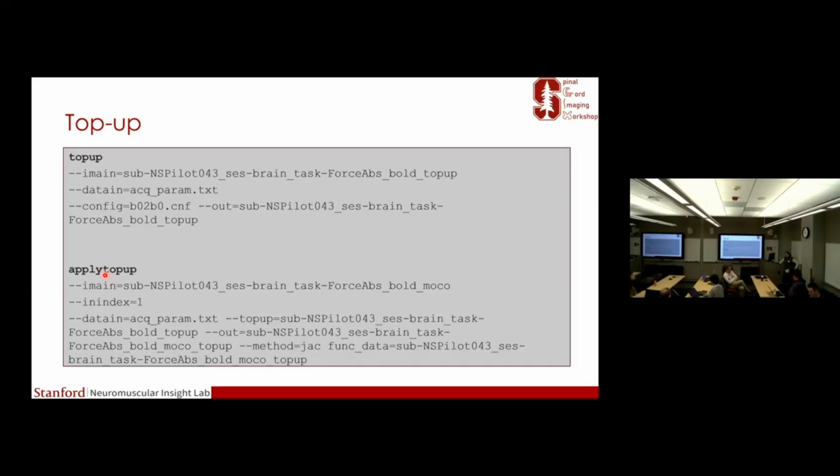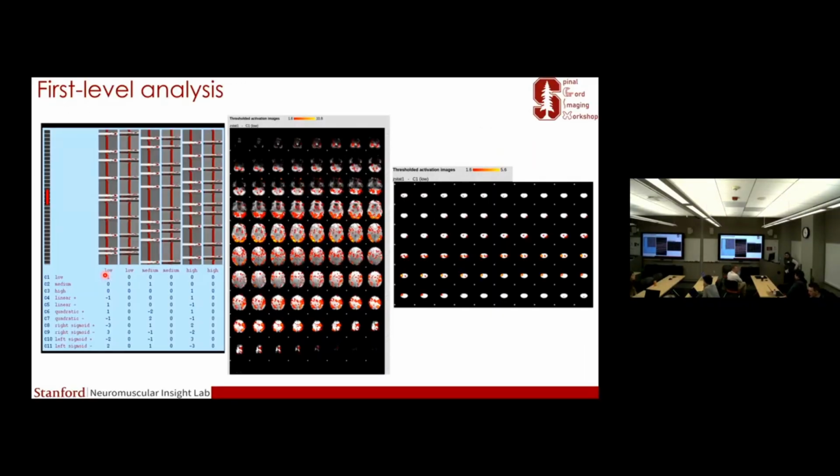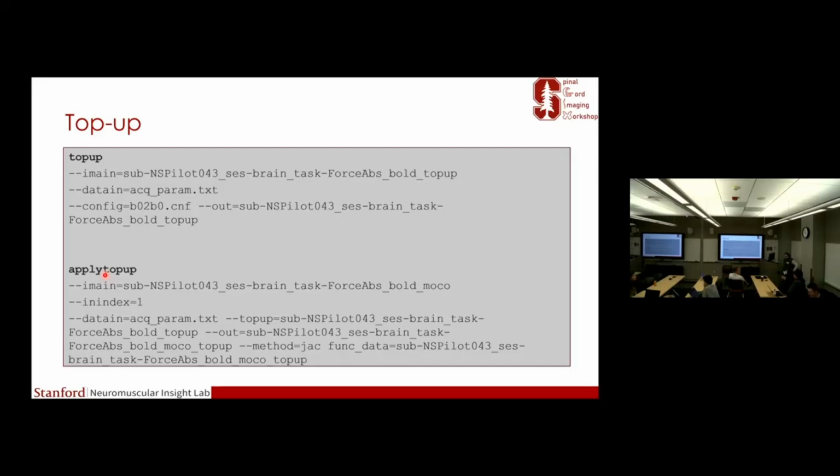Yes, all of this except the ANTs tool is based on FSL. It's a combined cortico-spinal acquisition, so the problem is the same.